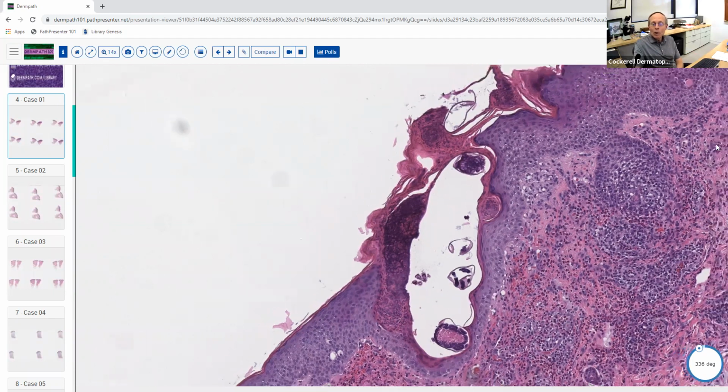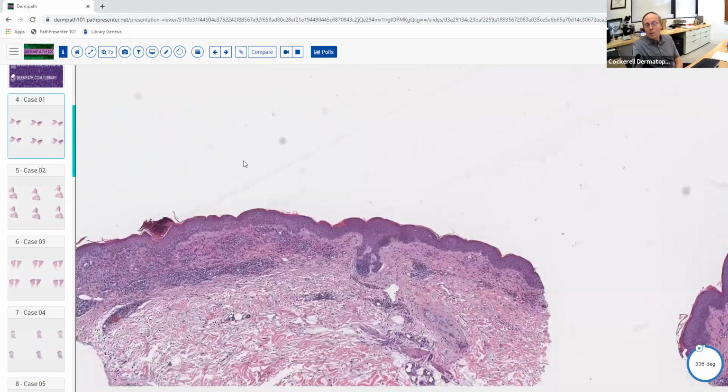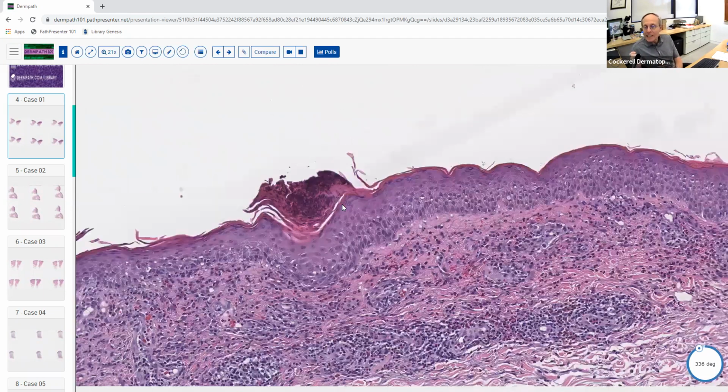And the teaching point about this over here is this is also the burrow. This is a subtle little area that's probably trailing where the organism once was. It's like if you ever go skiing out on a lake, this is the wake behind your boat. So this is the little burrow that's left over.